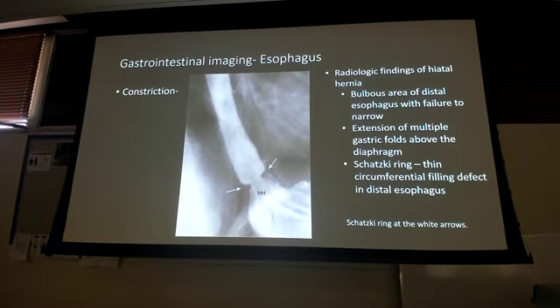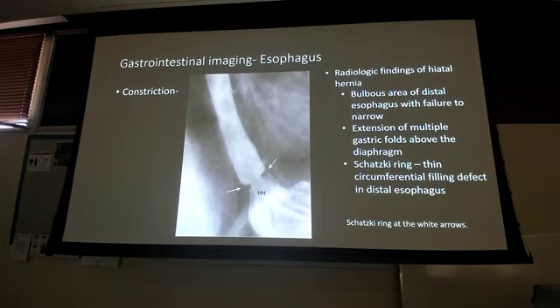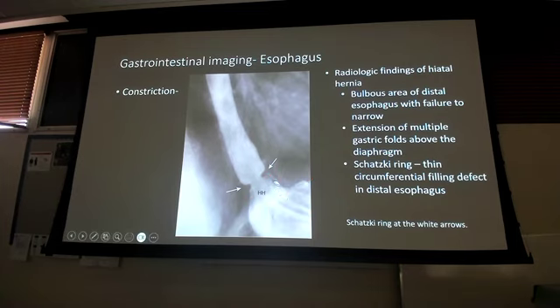Constriction. So notice how this is not constriction, it's completely closed off, causing dilation of the esophagus. Notice how on the constriction, the esophagus is tubular, it's smooth, it looks like it's supposed to. It's not super dilated. What's happening here is it's slightly constricted. In this particular case, you have a hiatal hernia. And so what happened is this is all part of the stomach, and this is my diaphragm. It is projected up through the diaphragm. All right, that's a hiatal hernia. So what you're looking at here is a constriction. This should be down at the transition point of the stomach. And it's really not anymore because I have a hiatal hernia happening.